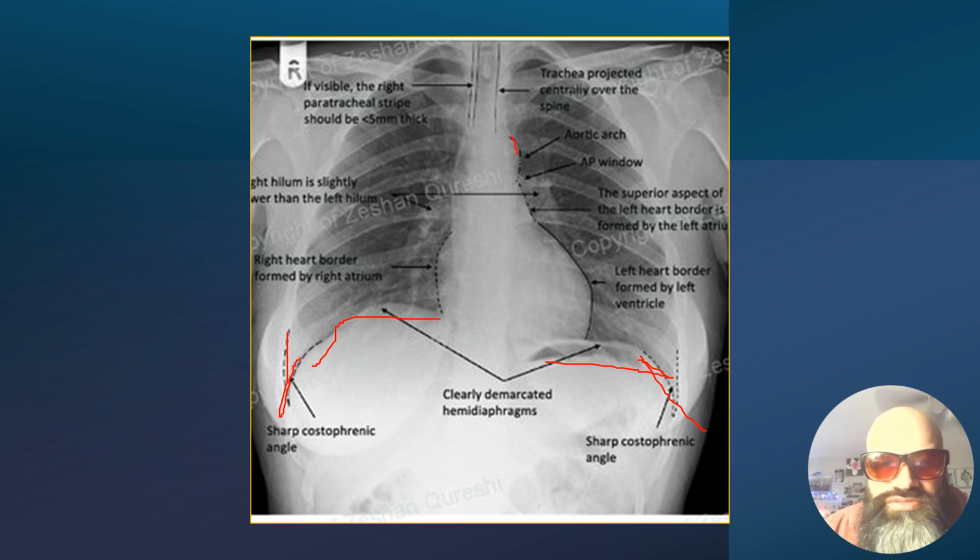You can trace the border here of the aortic arch and your left ventricle. The heart will sit directly on the superior aspect of the diaphragm. But you should be able to see clear, distinct borders between the heart and the lung parenchyma region, as there are differences here with the air and fluid densities. Over here we have the right atrium, the right cardiac border as well.